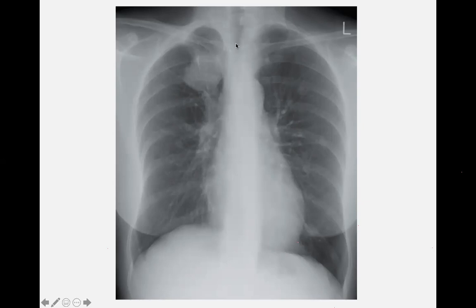What about the airway? Do you think it's in the middle? هي شكلها سنترال مع انه ما تبين او انا ما عارف اشوفها بس. ايه تقريبا بالنص, it doesn't look like it's on one side.